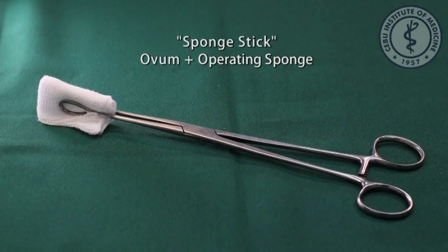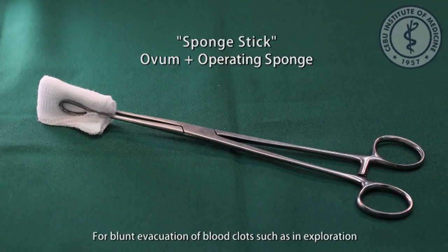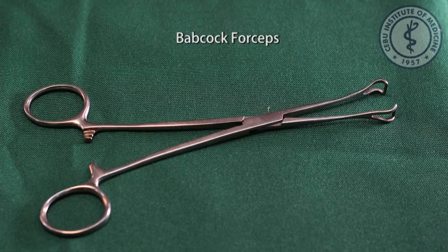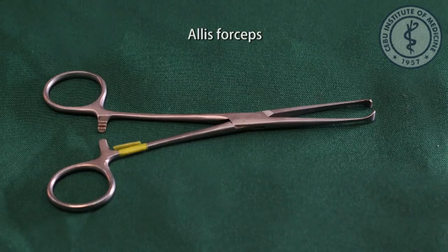Ovum forceps, or sponge stick, which is ovum forceps plus an operating sponge, for blunt evacuation of blood clots such as in exploration. Mixter forceps, or peanut pusher, which is a Mixter or Kelly plus an operating sponge ball, for blunt dissection. Babcock forceps, for grasping hollow or visceral tissue. Allis forceps, for grasping connective tissue.